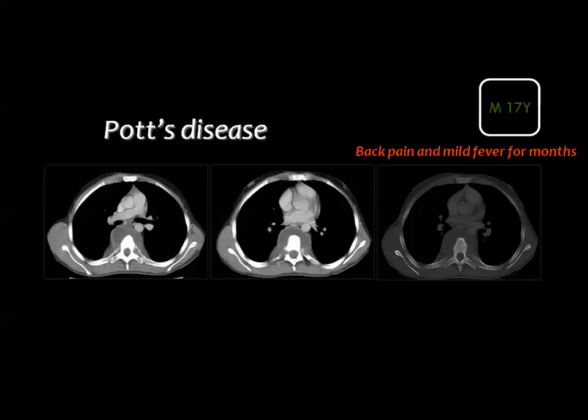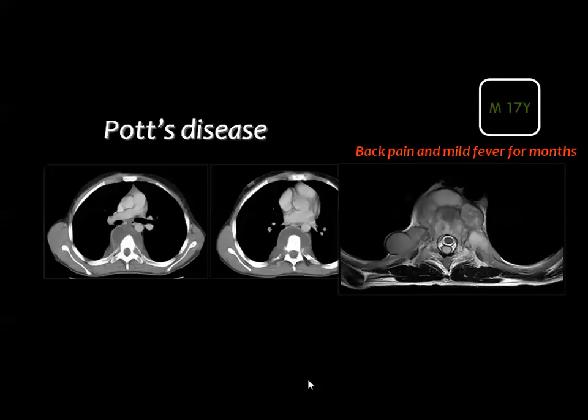Spinal lesions in the pediatric age that may present by mediastinal pathology in most of the cases are related to spinal infections by TB. And if you see vertebral erosions and involvement of the disc with prevertebral collection representing the cold abscess, this is tuberculous spondylitis.